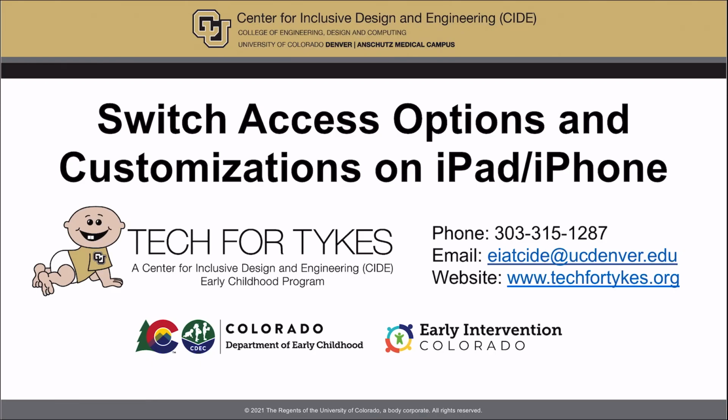Hello! Today I'm going to show you some different options to customize switch access on your iPad or iPhone. This video was created for learning purposes only and does not constitute an endorsement of any product or service. This video is a continuation of our previous tutorial, Enable Basic Switch Access on iPad or iPhone, and we'll review additional options and customization for switch access.